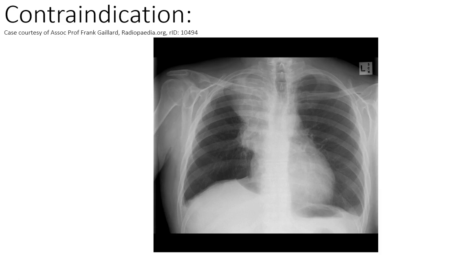This film is, again, if we just do it, somebody who's maybe got a little bit twisted, a little bit rotated, maybe they've got a little bit of a scoliosis. Spinous process, the clavicular head in there, clavicular head there. You see how sometimes I have to follow it down? Sometimes it's just really obvious and sometimes you have to follow it. So they're pretty, not too much rotation.